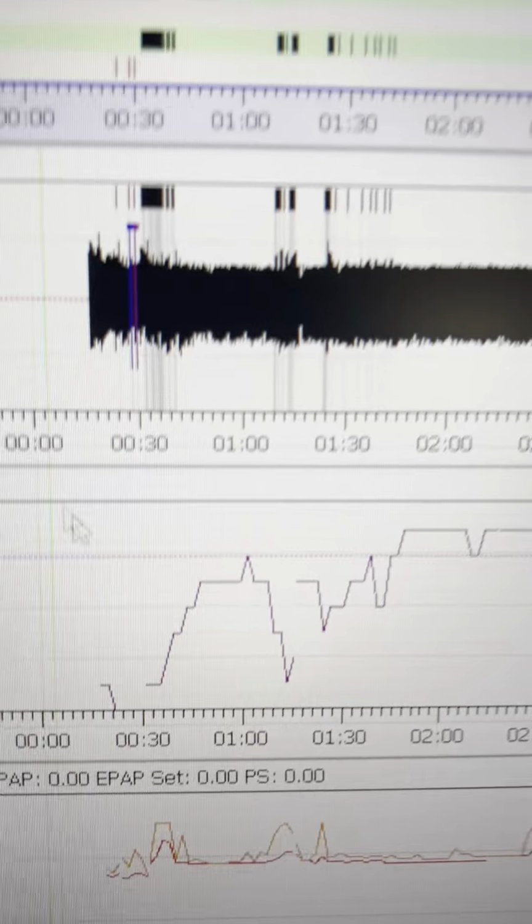See, there's no recovery breath, only there. But all of these aren't even like seesaw that much. They're all just cut off and weird. So I'm probably not trying, but also suffocating in a way. Here the same weird thing happens. See, and these patterns are basically gone now.